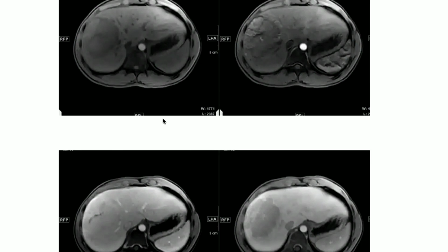Coming back to the post-contrast, agree, the scar enhances in the delayed phase. However, if you see the other findings, the lesion is heterogeneously enhancing in arterial, and we mentioned that FNH is usually homogeneously hypervascular, with a central scar. This is heterogeneous. And on the delayed phase, if you compare the lesion to the background liver, it's not iso as in FNH. Actually, it's washing out. It's darker than the adjacent parenchyma, right? Yes, ma'am. So the lesion is washing out.